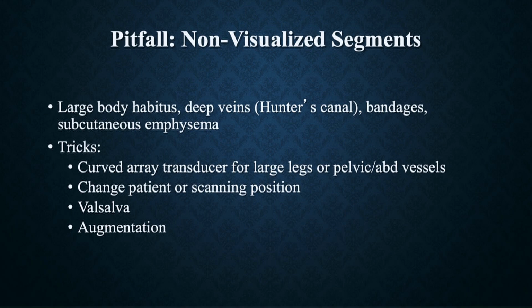So, non-visualized segments. We already talked about the fact that in very large patients it may be hard to see the veins, and if they're very deep, typically in Hunter's canal, it can be challenging. Overlying bandages, we mentioned subcutaneous emphysema.